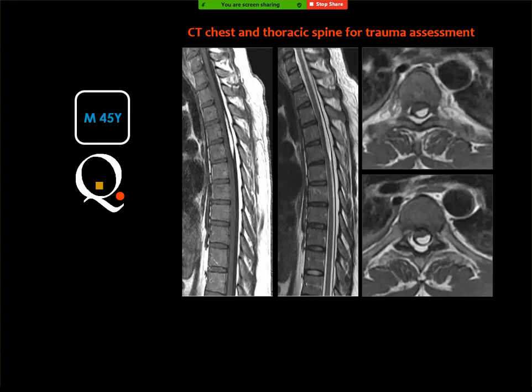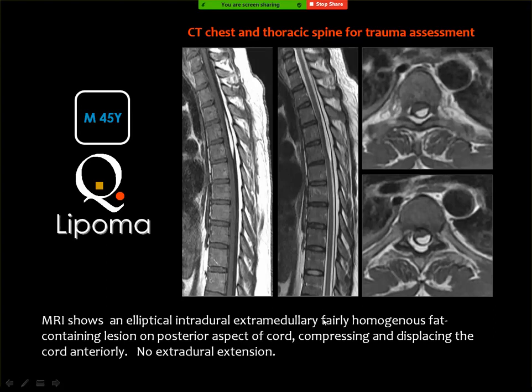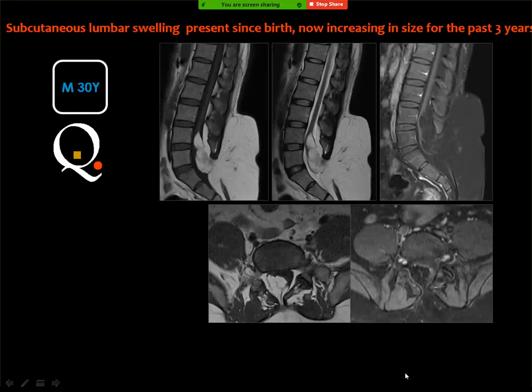Epidural hematoma. Okay, both possibilities are good, and there is a bright lesion in the T1 in the subdural space, and it is also bright in the T2 weighted image. Then both hematoma and lipoma can appear like this. In order to differentiate between hematoma and lipoma, you should have the fat suppression, and this was the case of lipoma. Okay, what do you think of this?